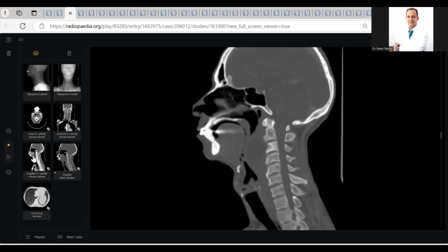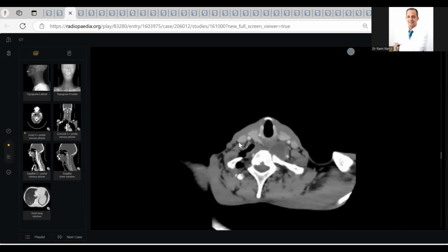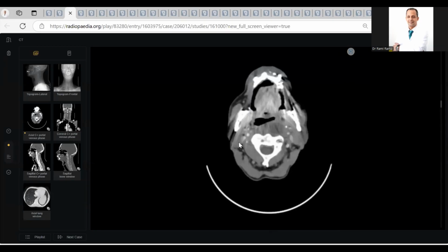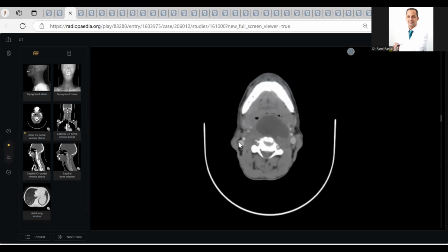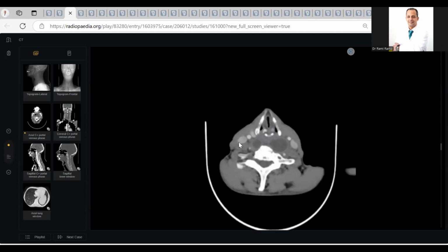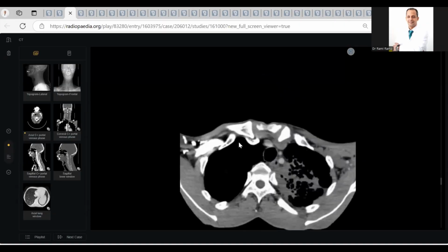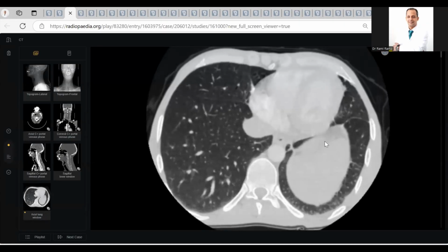I think I was showing you this. Okay, this is a prevertebral multiloculated peripherally enhanced collection, which means abscess. Prevertebral or retropharyngeal, no problem. But you came here and you told me there is upper lung consolidation. Very good. Ask me for the lung window.